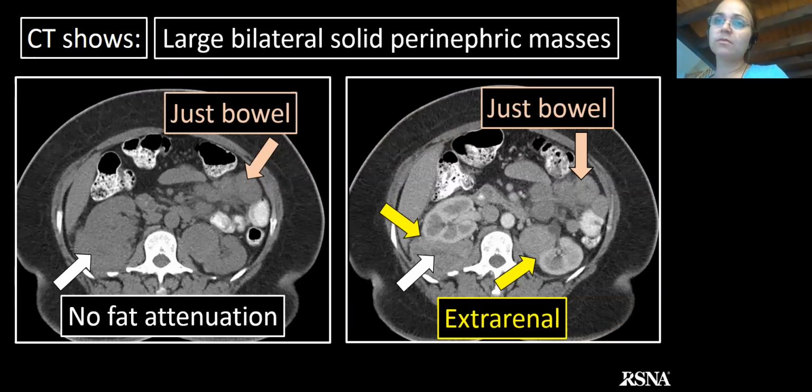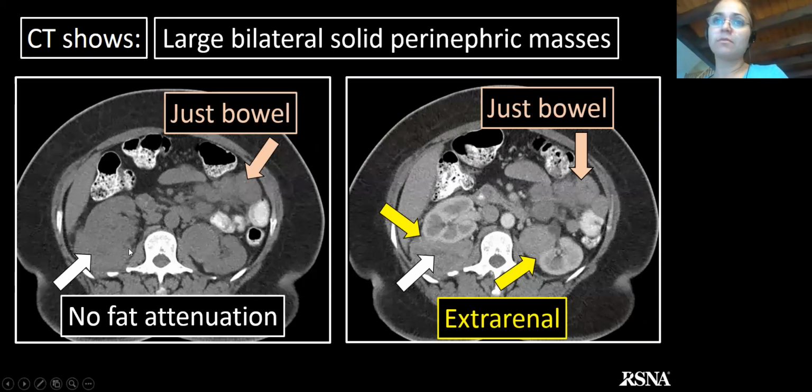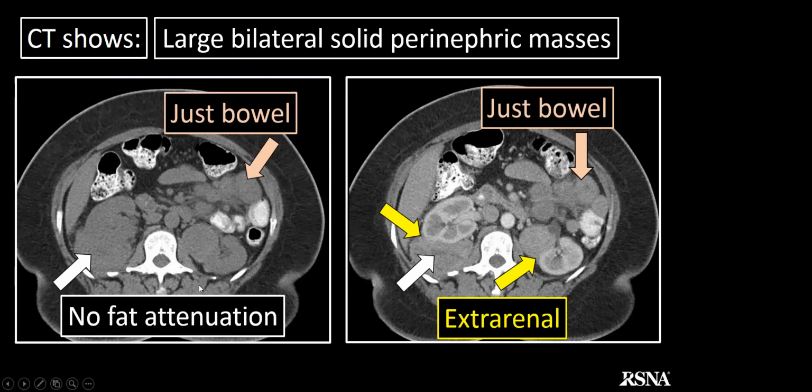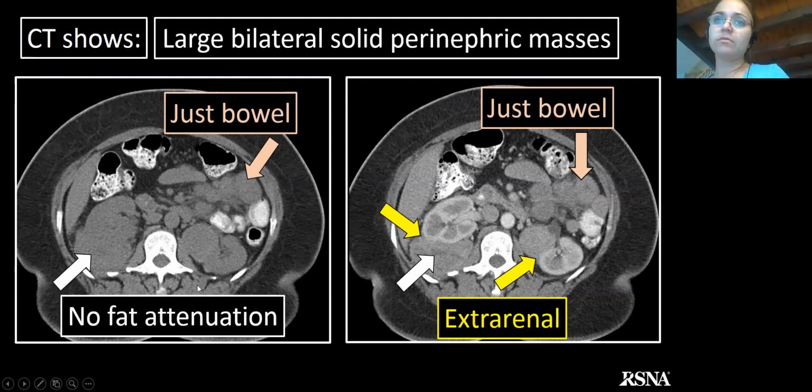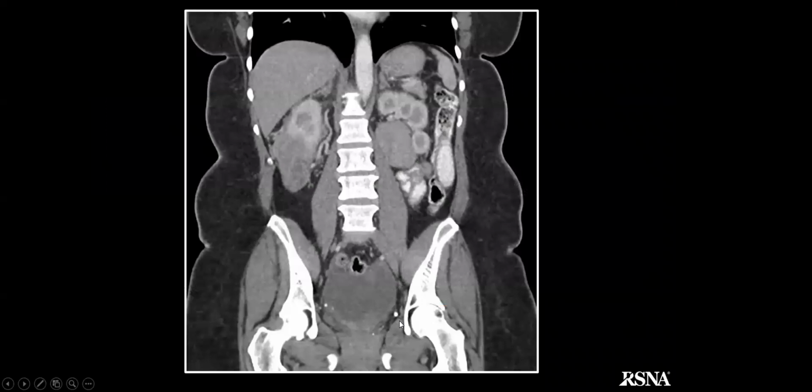Yeah, Erdheim-Chester has a CNS association with seizures and I guess random CNS stuff. But usually I think that they have that hairy kidney manifestation where it's just like a rind around the kidneys rather than bulky masses. This is like juxtarenal. Well, let me show you what I was thinking on this case, and you guys can tell me what you think.